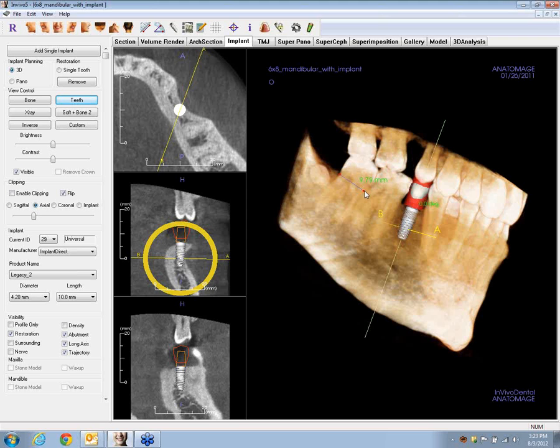No need to calibrate. At any time you want to edit or change where leader lines are or anything, we go ahead and click on it. It turns red, and we're able to edit it, change it, move where the measurement is portrayed and so forth, and it will stay where you put it. If you want to get rid of it, you just click it so that it's highlighted.